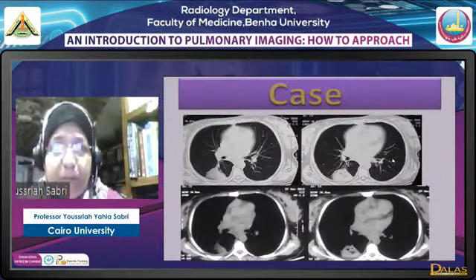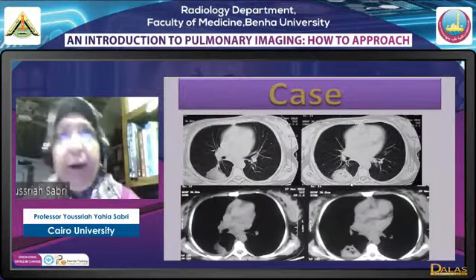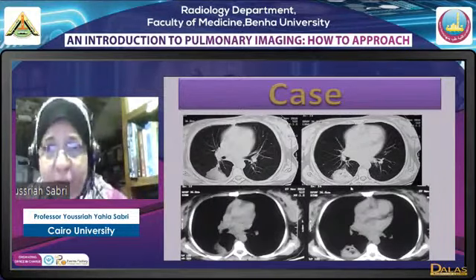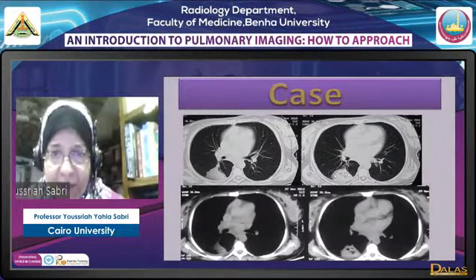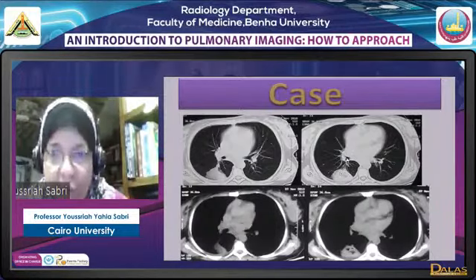Okay, we have here another peripheral lesion. But this peripheral lesion has many characteristics that should be known by heart. Number one, this peripheral lesion, which may be a mass or a nodule. Here we have a mass. Subjacent to it there is pleural thickening, and medial to it, joining it to the hilum, there are crowded markings.